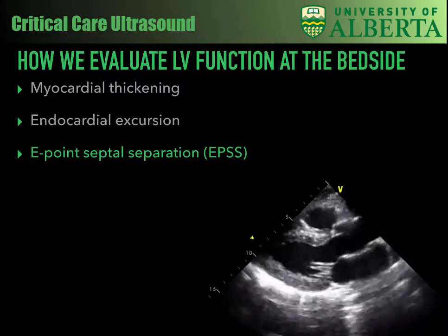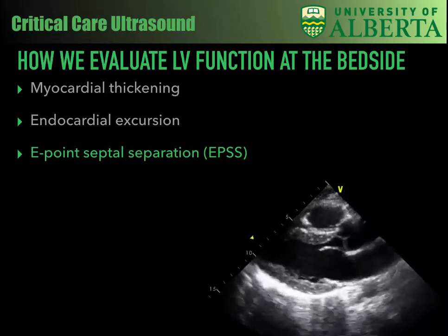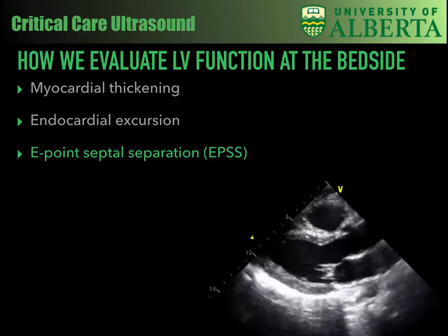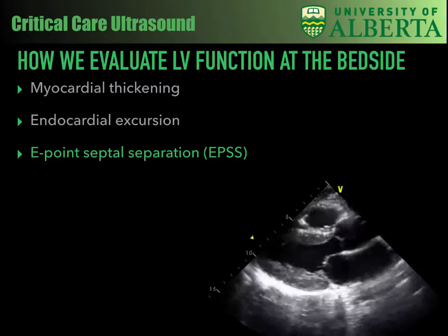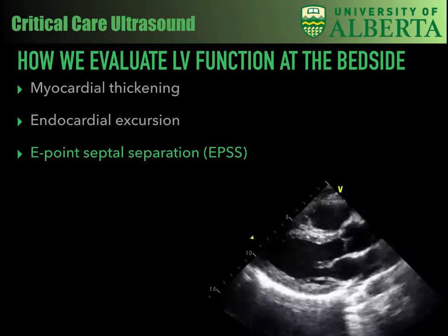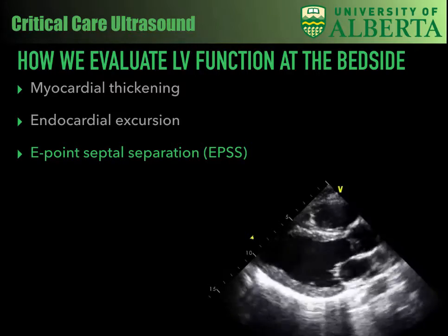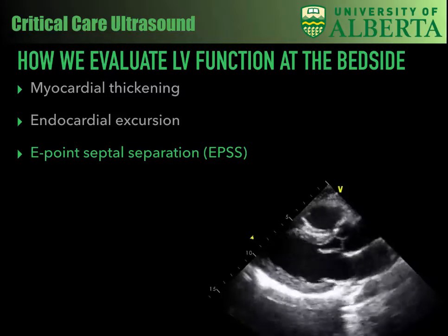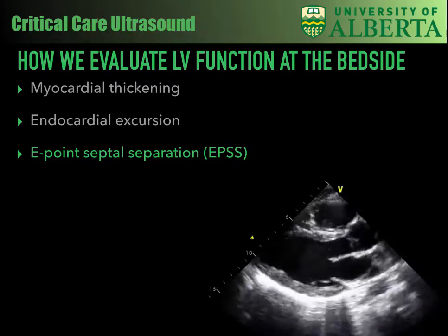Notably, things like a thickened or stenotic mitral valve may impair this type of movement. A reduced cardiac output will also have reduced excursion of the mitral valve, and also things like aortic regurgitation may reduce that swing of the anterior leaflet. So those are possible confounders of this method.